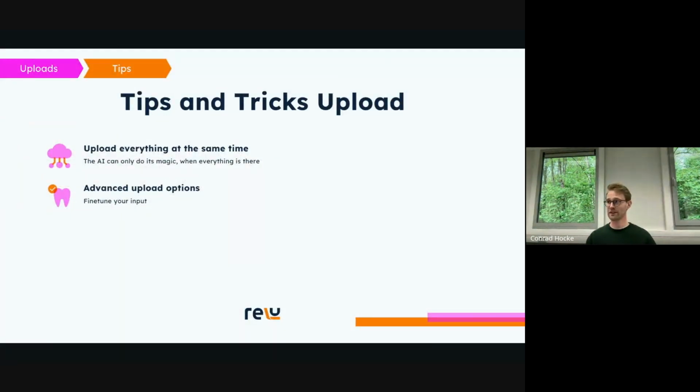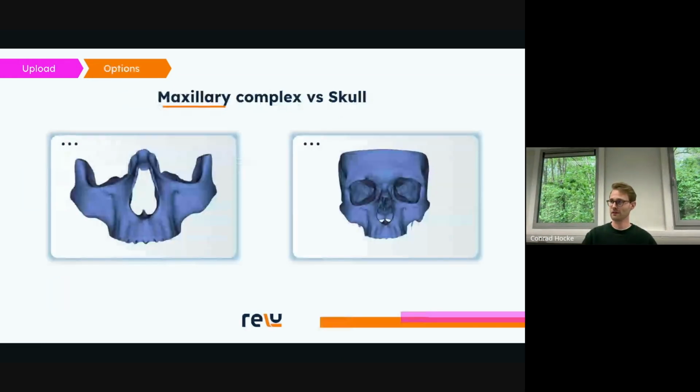Once we've chosen all the right files, we are presented with a multitude of options. First, we can choose what to segment. I was recently talking to a design engineer from South America, and he was wondering why he would only ever see a small portion of the skull segmented, even though the skull was fully visible in his scans.